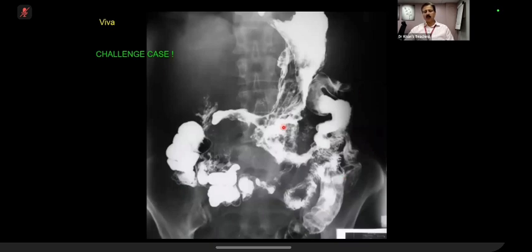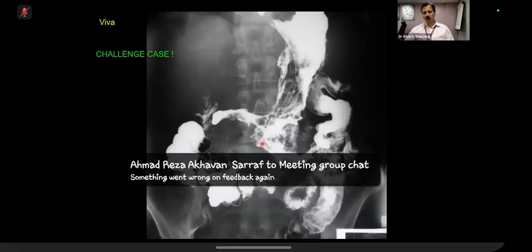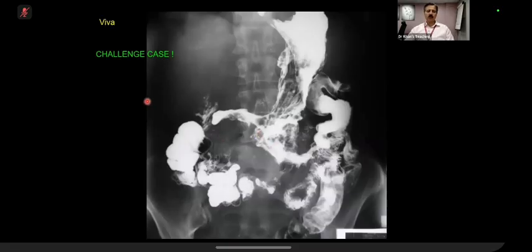On the other hand, there must be a fistula with a bit of jejunum also, either through the transverse colon or directly, because part of the contrast has gone into the jejunum. Now, what is happening? In the distal large bowel and small bowel, there is not enough contrast, and this is the ascending colon or the hepatic flexure where the contrast has gone. It does not go all the way around. So this is the type of film in which you have to stretch your imagination, should I say. Is the contrast at the right location or not?